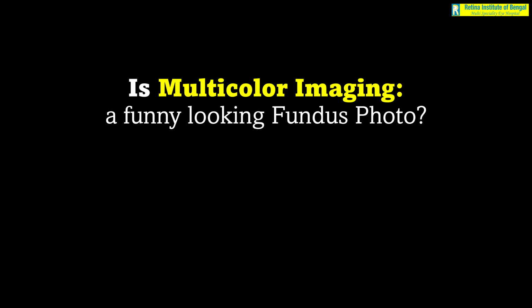So the question that we started with: is multicolor imaging just a funny looking fundus photo? Because people who have never seen a multicolor image initially struggle to adjust to it. When you look at a CSR, you do not expect a greenish round image instead of the normal serous detachment as it appears in fundus.